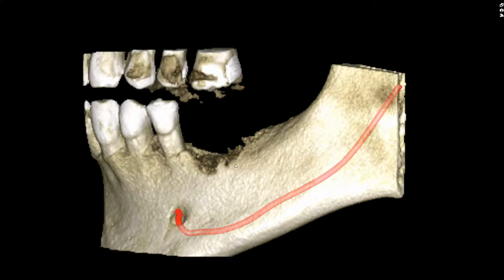Our goal is to make sure that the material is fully osseointegrated to the surrounding trabecular bone and cortical bone as well. And so that's what we want to see. Okay, so what I have here is a 3D rendering of the area along with a highlighted or traced mandibular canal, and that is something that I have done myself in order to make sure that when the doctor is treatment planning an implant, I give that person an accurate measurement of the ridge. So that is something I do for every mandibular scan.